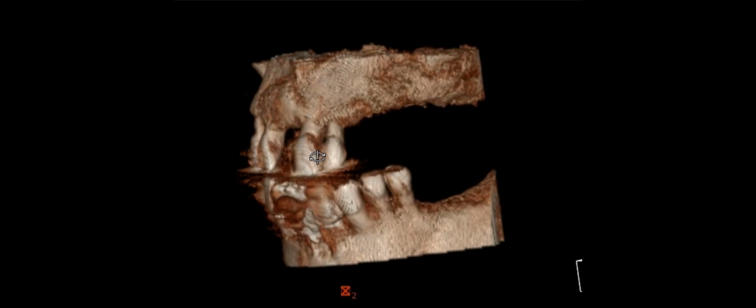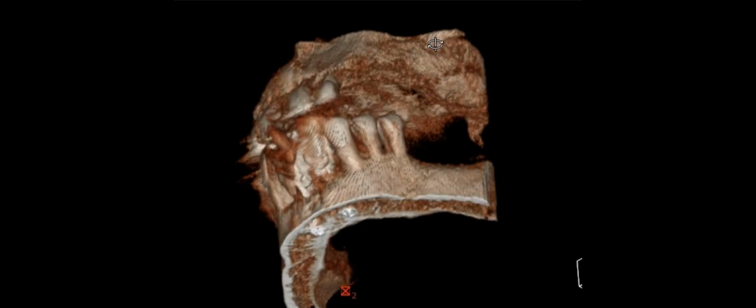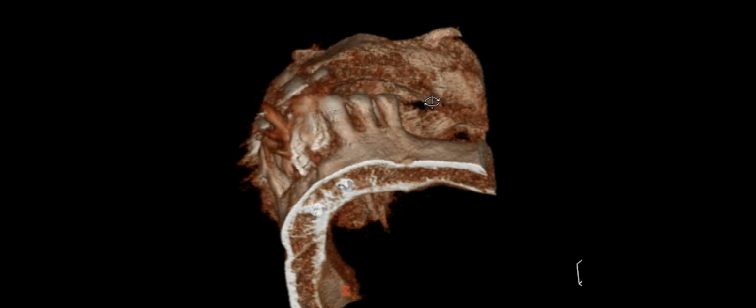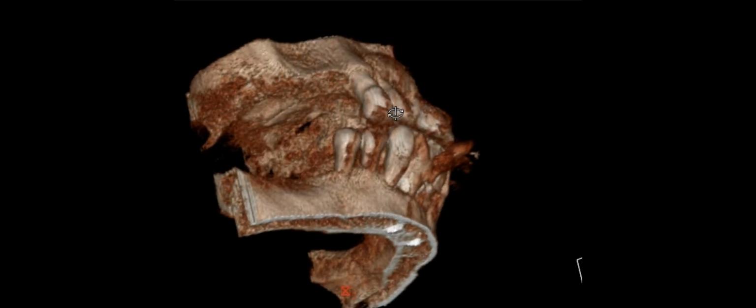Okay, so subsequent to extraction of the hopeless teeth, so the front tooth here has been extracted, the bad teeth on this side have been extracted. We've only kept 4 upper teeth. That tooth that was bad here and this tooth up here was extracted, and you can see evidence of bone grafting, bulking out the bone ridge here, and similarly grafting in this area here. And we didn't do any significant grafting on his upper right side because the width there was adequate at the time.